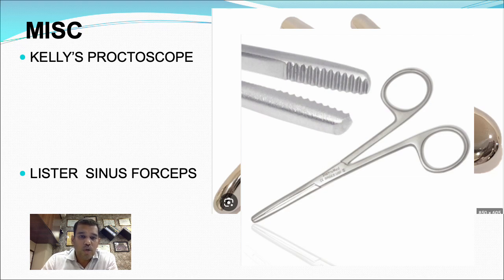So in order to avoid injury to this structure in this vital area, you just give a skin incision. You don't go deep inside the subcutaneous tissue. You just give a small skin incision, and then you repeatedly bluntly dilate with this instrument, and once the pus comes out, you can evacuate and suck all the pus. So you use this for blunt dissection in the abscess cavity to avoid injury to the neurovascular bundle.